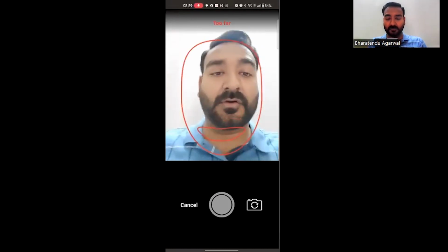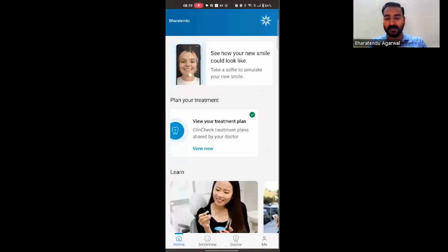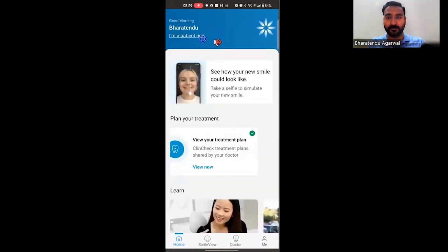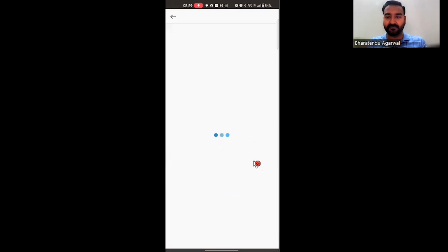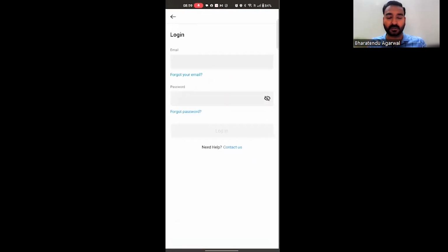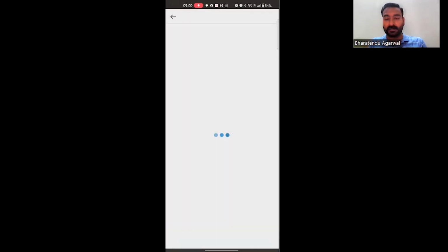All right. So let's go back. Let's go to home and let's go to the section where we will. So I will be clicking on I am a patient now. So I am a patient now. Have you picked up your aligners? Yes, I have. Congratulations, your account is being converted to a patient. You will be automatically logged out to finish converting your account. All right. So now we have to re-log in. All right. Now it's logging us in.